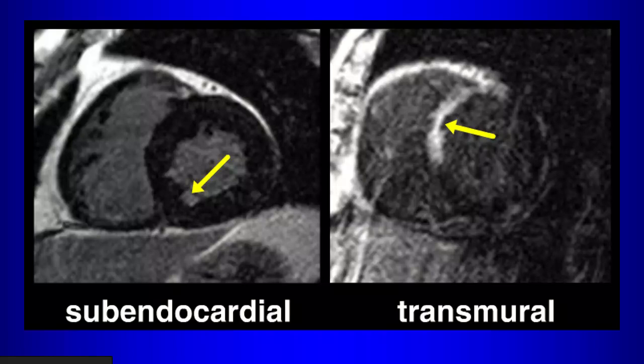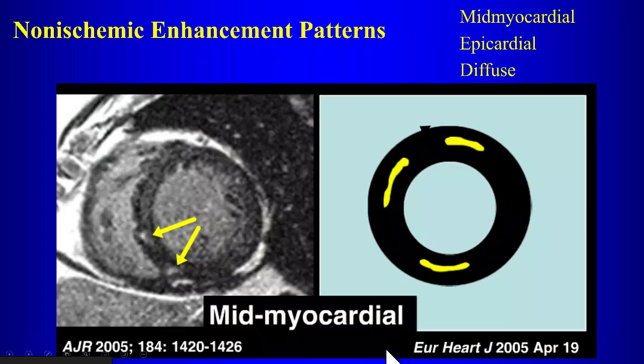No, this is an infarct. This is not from a non-ischemic cause. Embolization, small emboli, right? If there's an emboli causing infarct, you might have small areas of infarct like that, okay? Or it might be transmural, as in this example, right? So it's involving all of the myocardium there.